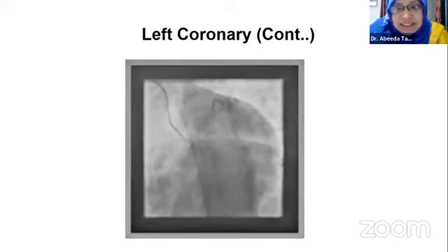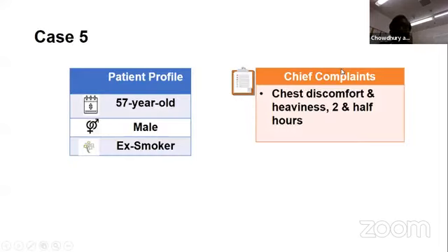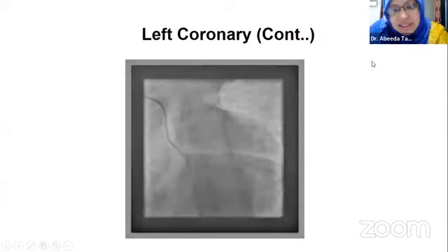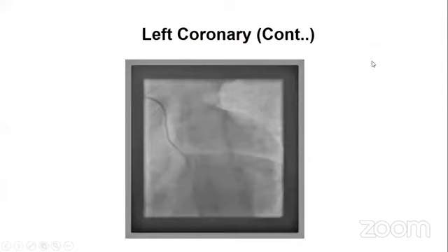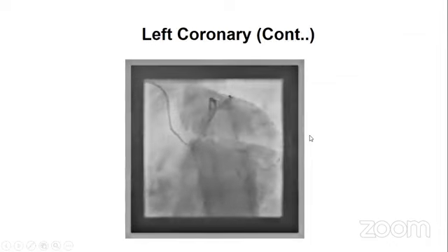Sir, did you do any ventriculogram? No, sir, we did not do the ventriculogram. That would have shown whether there was any aneurysmal dilatation or not, this akinetic segment. Okay, yes, sir. And sir, regarding the coronary status, that's a recanalized LAD.